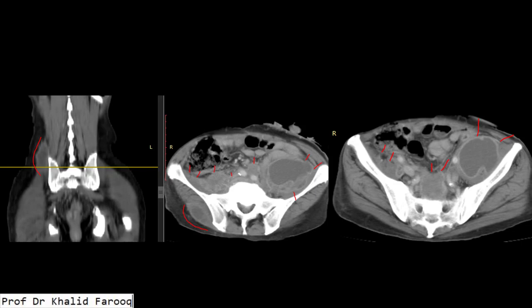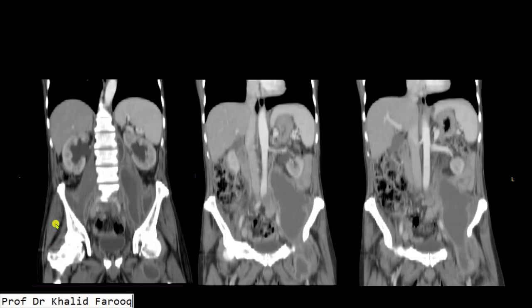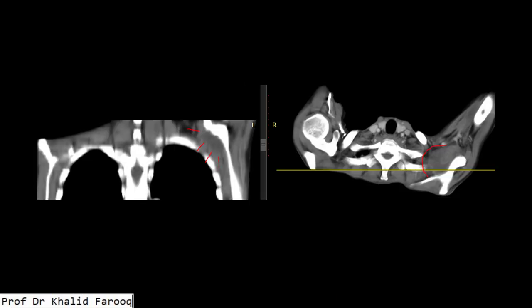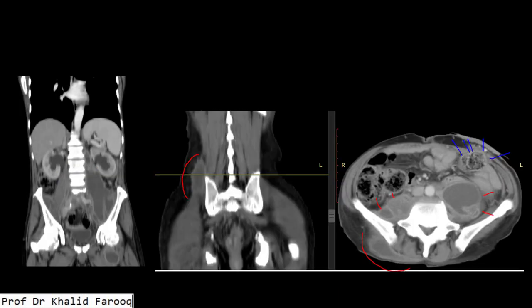So after chemotherapy, this patient developed fever, and this fever was because of multifocal abscesses predominantly involving the iliopsoas region, gluteal region, and an area around the left shoulder, while solid abdominal viscera, bones and lungs were unremarkable without any evidence of metastatic disease. However, we can see mild bilateral hydronephrosis because of inflammatory changes around the lower ureters, which are associated with iliopsoas abscesses.